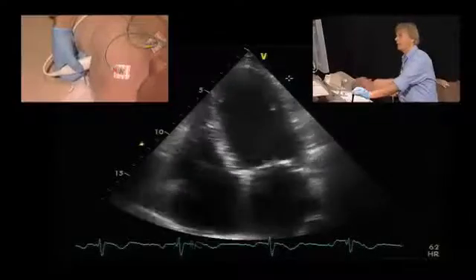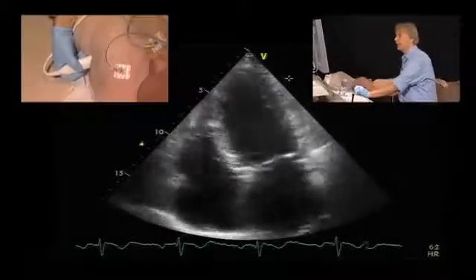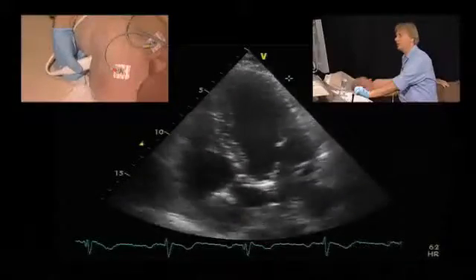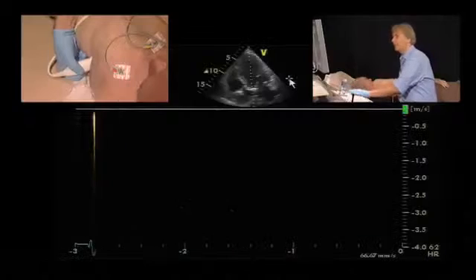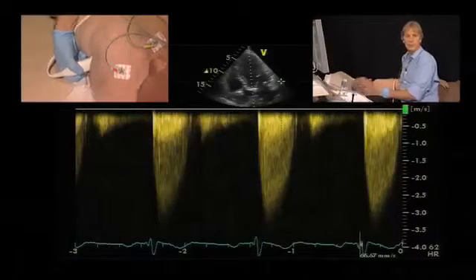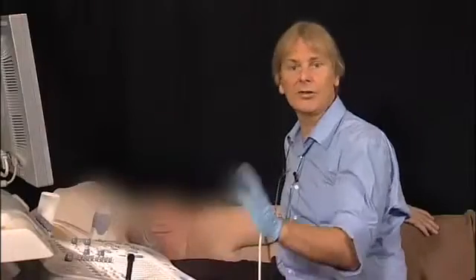So if you look at all the factors together, look at left ventricular function, look at the morphology of the aortic valve, and then also look at the shape of the aortic valve signal. The earlier the peak is, the less severe it is. That can also somehow give you a clue. But it's also only a clue. To really know if aortic stenosis is a problem or not, you have to do other tests, in particular stress tests.